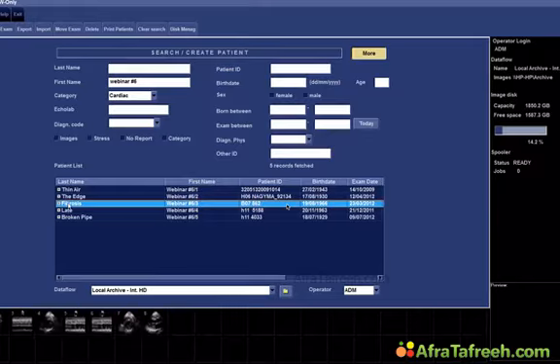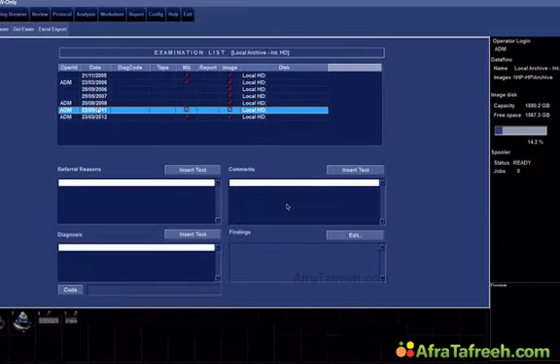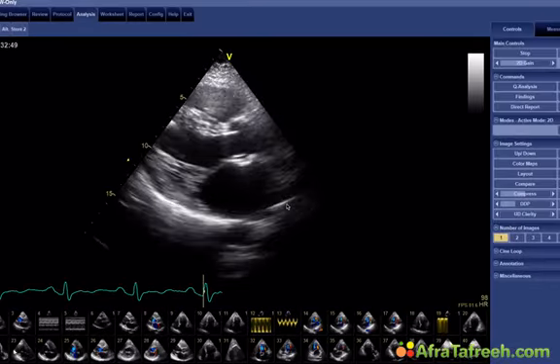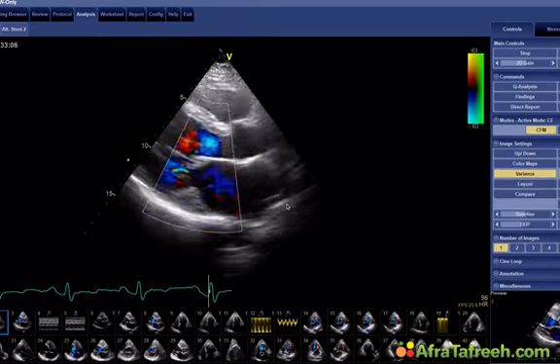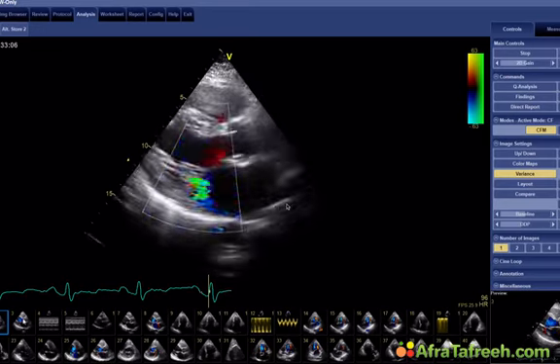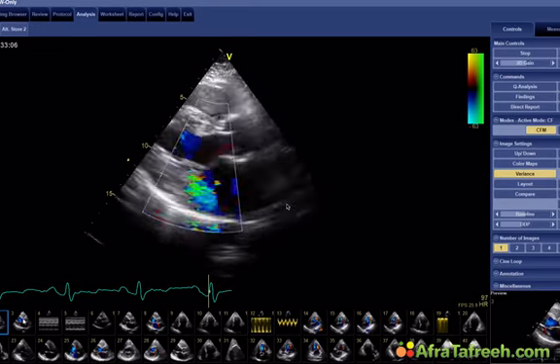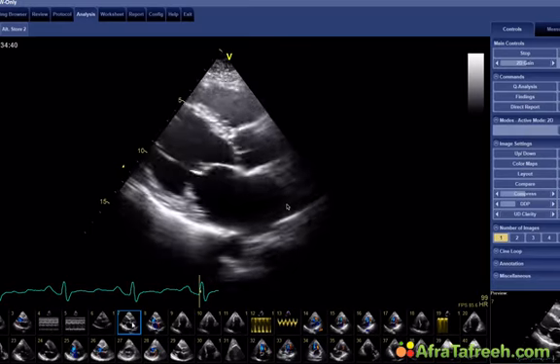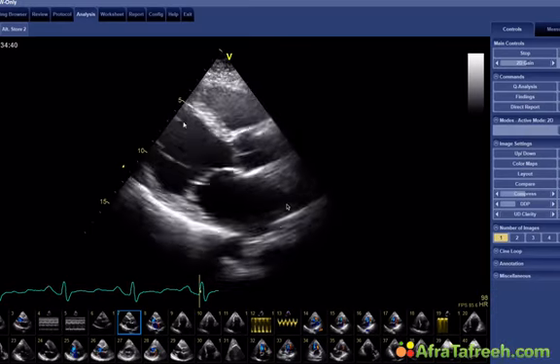Let me show you this study. Okay. Now he was on therapy. His heart rate again was going up. He was now in the range of 100. He was again under diuretics, and the doses he needed were increasing. And he was in a very poor condition.